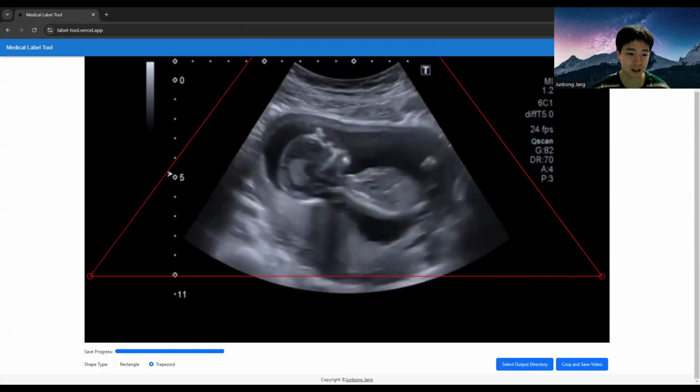Let's see. So in the label output folder, all the metadata for the cropping is saved here. I saved it with a timestamp so that the most current one is probably associated with the last video that's produced. So here is the first video that's cropped.